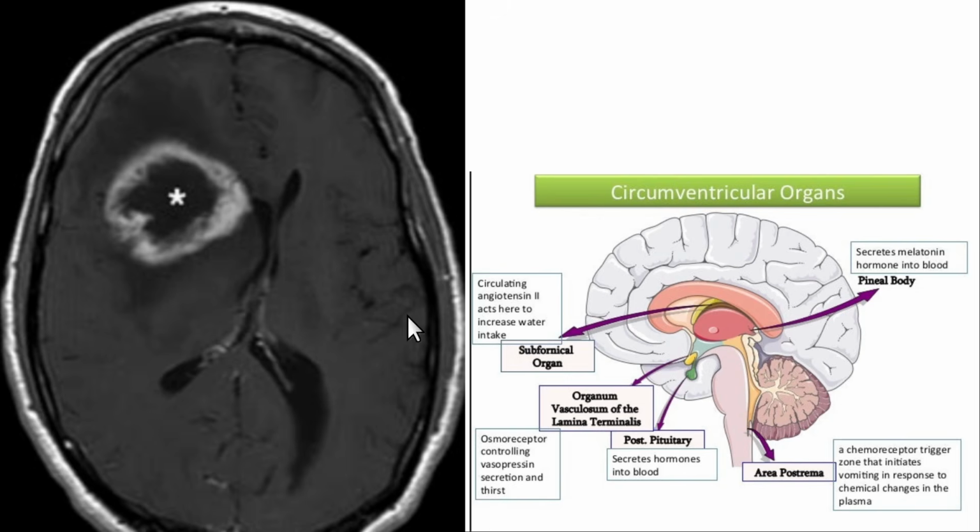Okay, then here's the last slide of the talk. Here is a tumor, glioblastoma multiforme. We often abbreviate them GBMs. And here you've got a loss of the blood-brain barrier, which normally keeps stuff out of the brain parenchyma, because the tumor has eroded through it. This bright stuff here is the uptake of contrast.